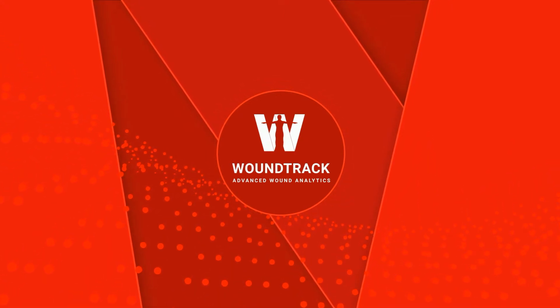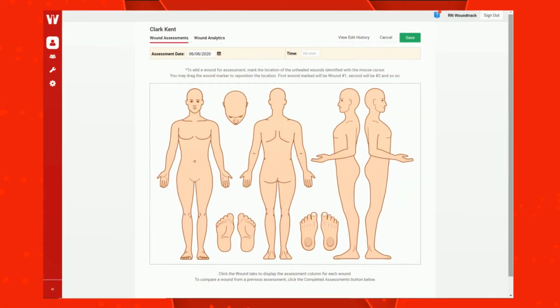While there are many time-saving features in the Woundtrack system, this short demo will show the core functions that will benefit the greatest number of users. The wound assessment and the wound analytics.